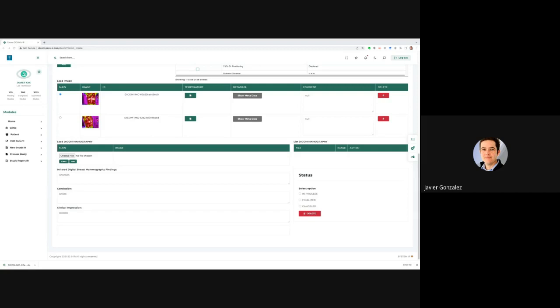Here it is. For some strange reason, I cannot drag the finder to the other screen.